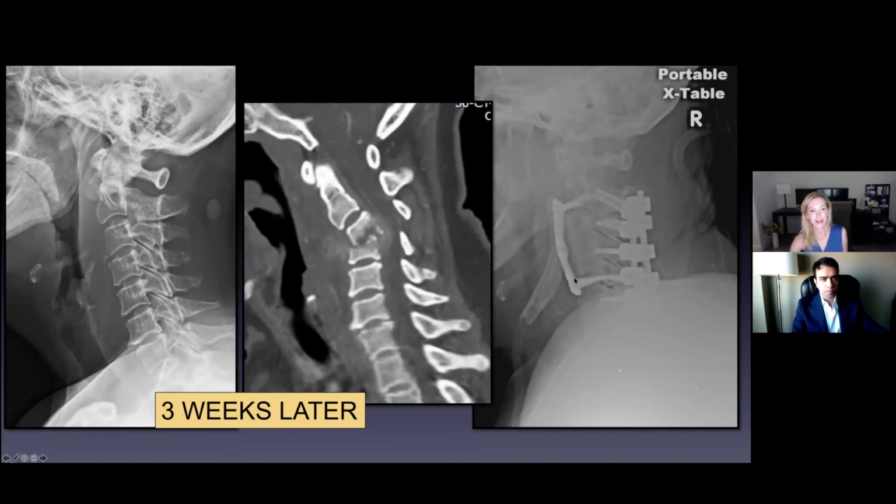Do you want me to say what this is? Okay. Here you have your posterior approach. Here you have a fibular graft, which Dr. Rasouli can talk about. And here you have anterior. That I have to agree with. This is a surgical frame. We're looking at this lateral, so compare this to that. I think the fibular graft is important to know because that's something they haven't seen.